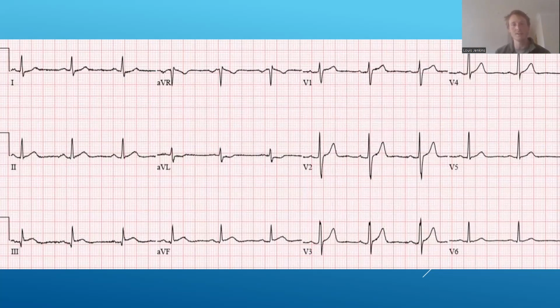It looks sinus, like it's regular. There's a P wave before every QRS. The axis is normal. There's normal looking R wave progression. I would say generally this ECG looks pretty fine. But after looking at the forest is when we look at the trees individually.